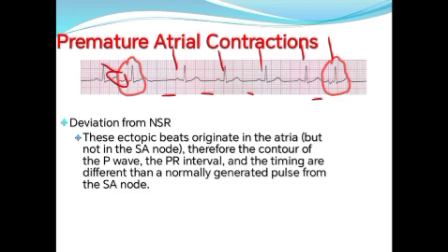And also we have premature ventricular contraction. We have to compare between them, and not do them together. And I will talk about it.